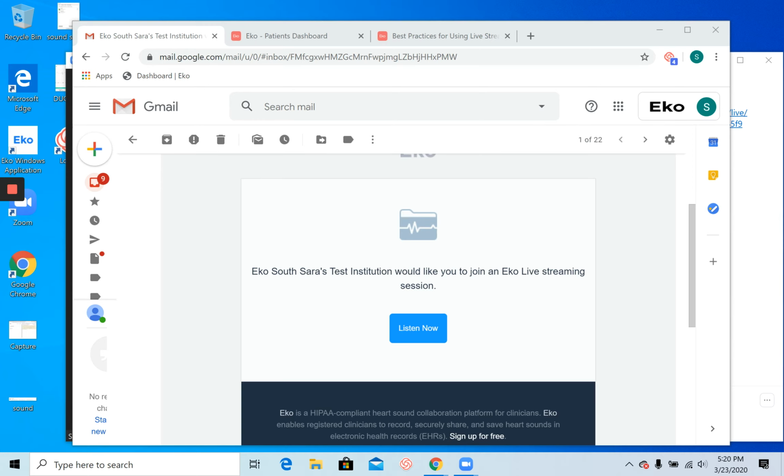Today we are going to review how to access and listen to the live stream from the telehealth consultant side. The telehealth consultant may access the live stream link through a number of ways.